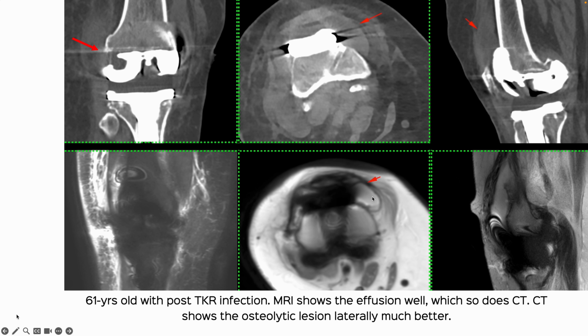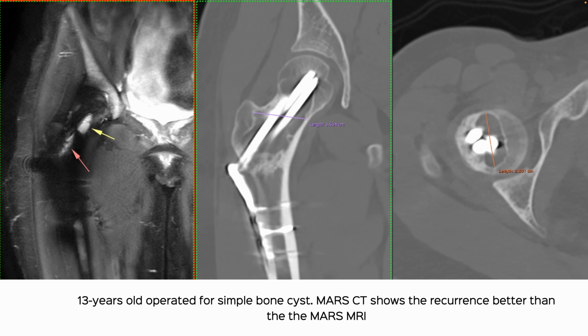Look at this one. So there's effusion, which you can see here. This patient had infection in the knee post TKR. But the area, there's no marrow edema now because it's quiescent, but the osteolysis here and the soft tissue here are so much better appreciated along the lateral aspect on the CT than the MR.